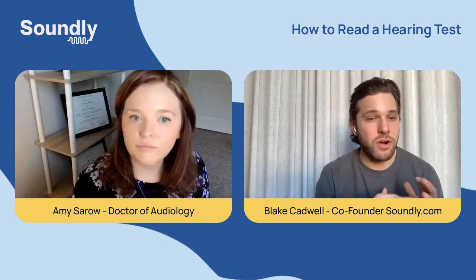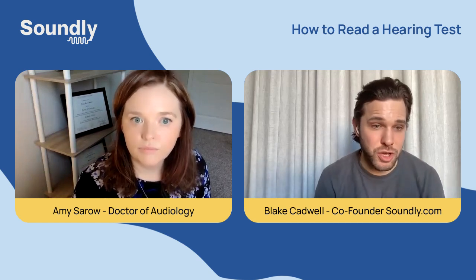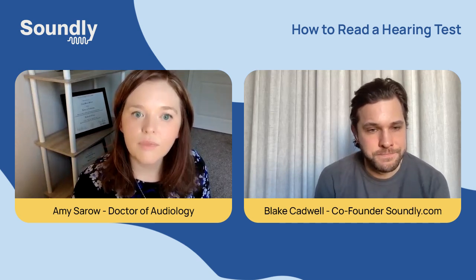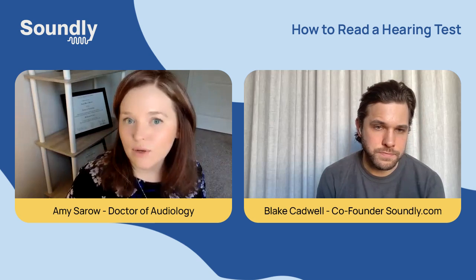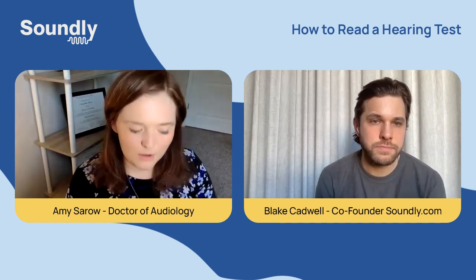Think about this chart. There are some patterns. Folks will often fall into these kinds of groupings or patterns. I mentioned a cookie bite, which is my hearing loss. But can you talk to us about some of the most common patterns that folks might be seeing on their hearing chart? One of the most common types is called a sloping pattern, where the person has low frequency hearing in the normal range, or they hear better in the low frequencies, and then it will slope down as we go higher in frequency. So that person has trouble hearing the consonant sounds, hearing those bird sounds also.